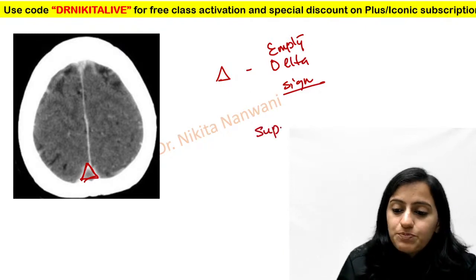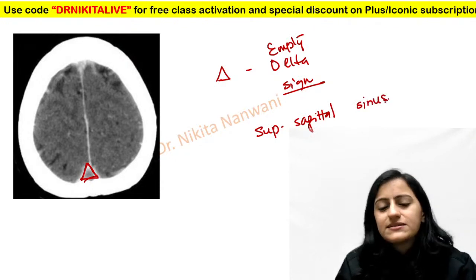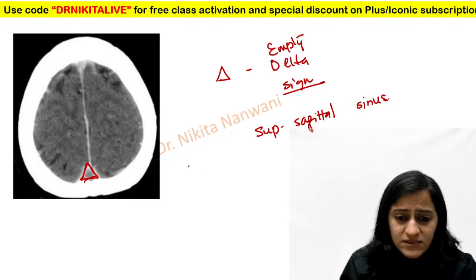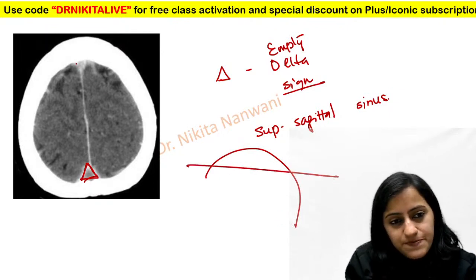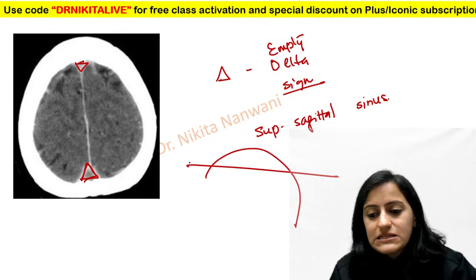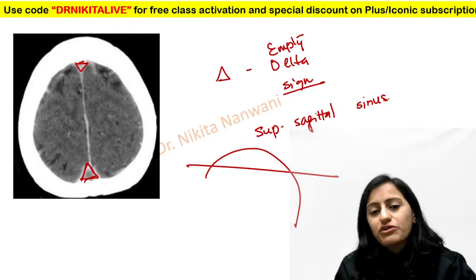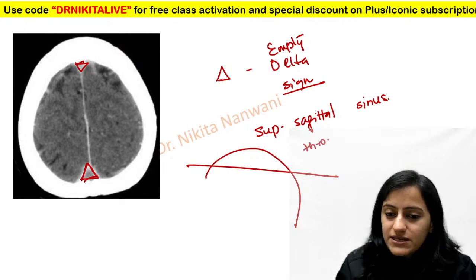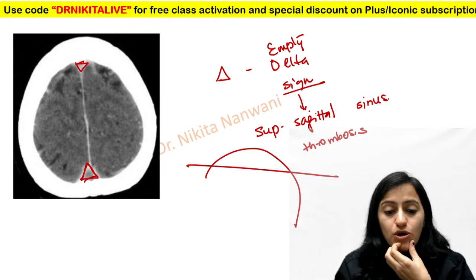This is the superior sagittal sinus. So your superior sagittal sinus runs like this, and when you take a cross section, you'll see it anteriorly and posteriorly. So basically on a contrast scan, any vessel not filling with contrast tells you it is a thrombosis. So this is superior sagittal sinus thrombosis.